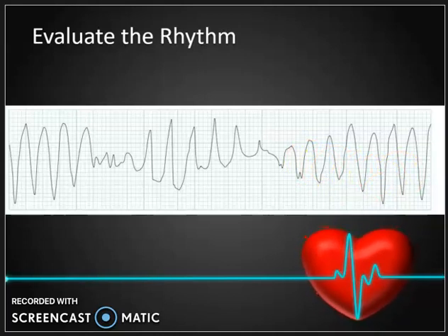So hopefully these steps are going to help you interpret some basic EKG rhythms. So utilize these steps, try to figure out what is what.